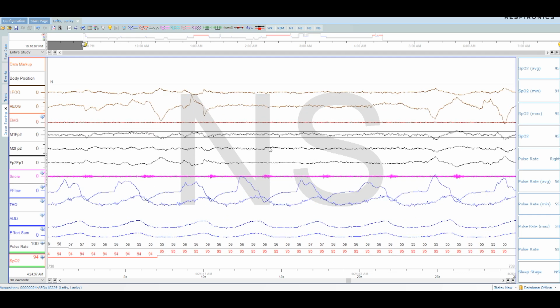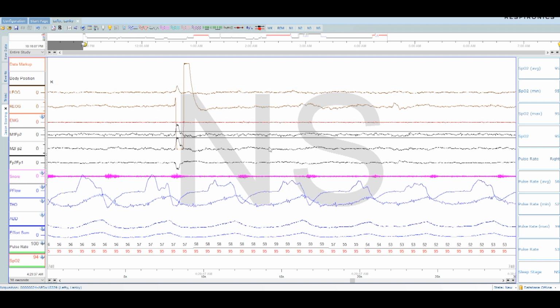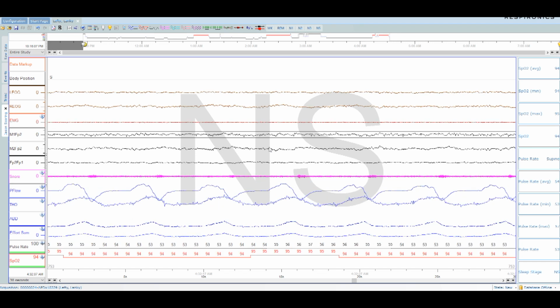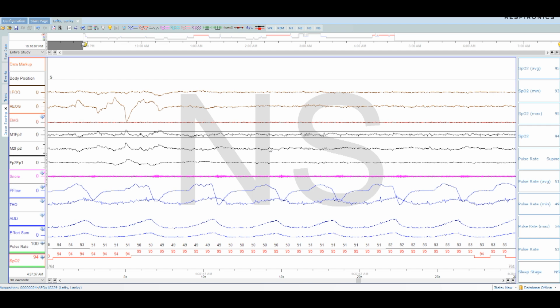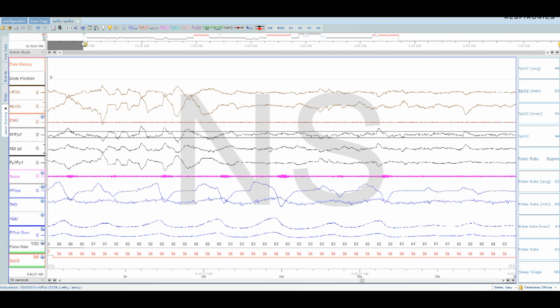But in people who are fairly healthy, normal sleepers, will tend to get that kind of breakdown or something close. Usually delta or stage N3 is the lowest of them, especially as you age, for sure. I'm definitely aging. So all this is REM. You can see the eye movements. You can see the thin chin, and if they're asleep with that, for the layman, that's probably a good way to go.